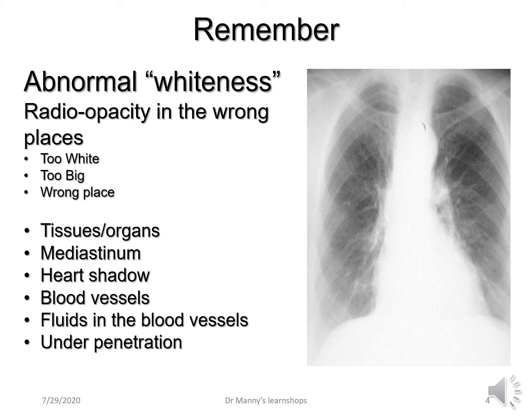Then you've got underpenetration. Underpenetration, a technical problem, and this will increase the whiteness on your chest X-ray, or it will make structures appear whiter than they normally are, which could obscure or hide certain things that you might be looking for.